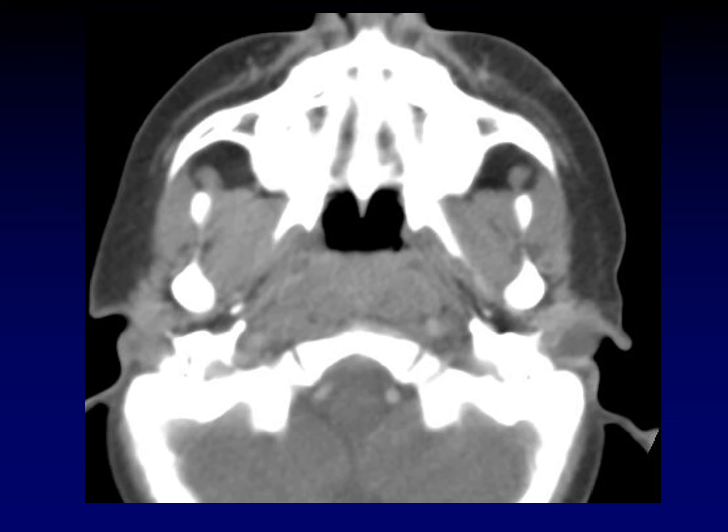All right, now let's turn our attention to first branchial cleft cysts. There are type 1 and type 2 first branchial cleft cysts. When you see a type 1 branchial cleft cyst, you can think of it as a duplication of the external auditory canal, because it kind of is that. It usually will have communication either to the skin surface or to the surface of the external auditory canal, and a little pit will be visible clinically inside the external auditory canal. So we expect a first branchial cleft cyst type 1 to be right near the external auditory canal. That's its key imaging location.